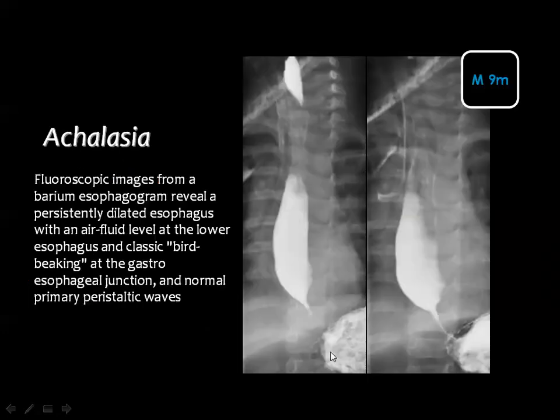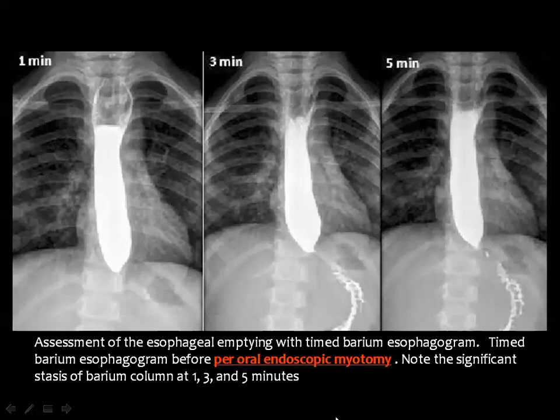of the proximal esophagus. And you see here that the esophagus is dilated and is harboring a lot of barium with smooth tapering or narrowing of its distal part. This is known as the bird's beak sign or the parrot beak sign, whenever you see that the distal segment of the esophagus is smoothly narrowed with proximal considerable dilatation.